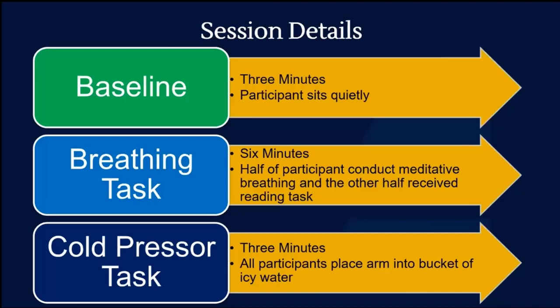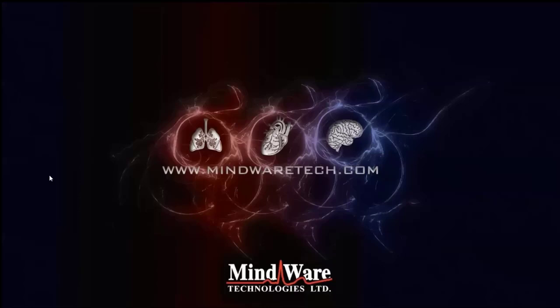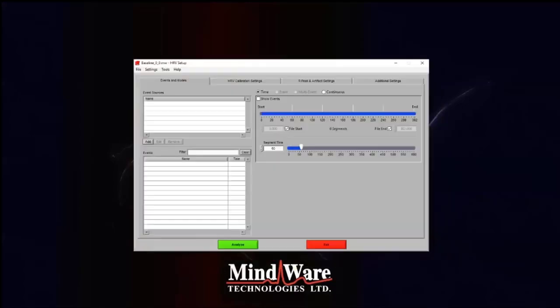So I'm going to go ahead and exit this now, and we're going to jump right into the MindWare HRV application. When I go through this, I'm going to be referencing some support articles, some online features that everyone can access at any time. It's free. There's no login. And near the end, I'm going to show you exactly what that looks like. So if you're a little bit confused on where to find the information I'm calling out, don't worry about it. I will definitely cover that in the end.